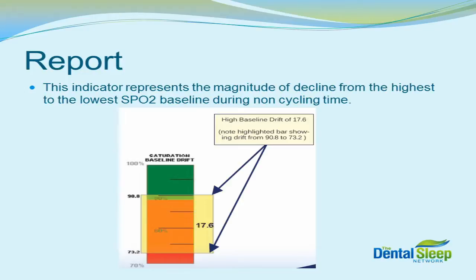So this is an excellent graph. This is your safety valve. This is telling you that there are other problems. And if this graph appears in the red, then we need to send the patient to a specialist.